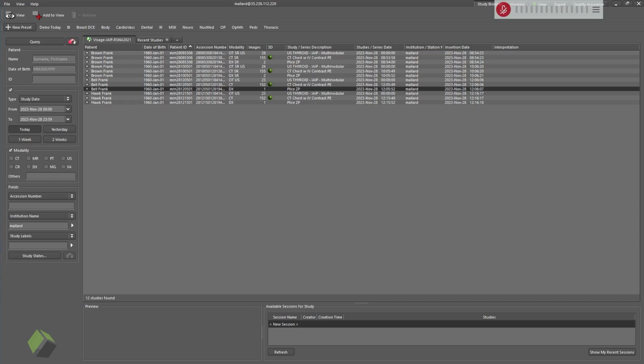Let's set the clinical scenario for this situation. Frank is a 65-year-old male who presents to the local ED having fallen during a mountain biking accident. The ED triage nurse notices right-sided chest pain and an X-ray is ordered.